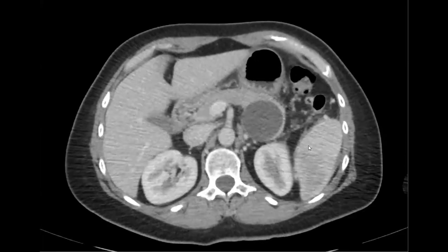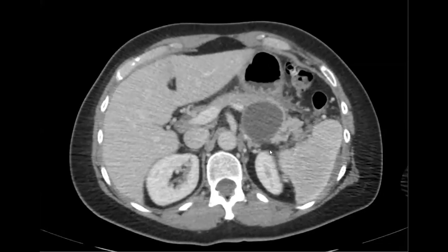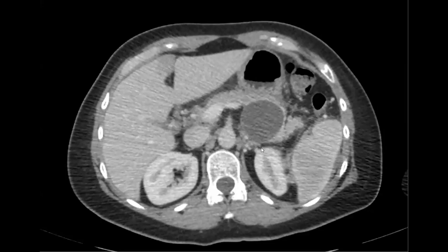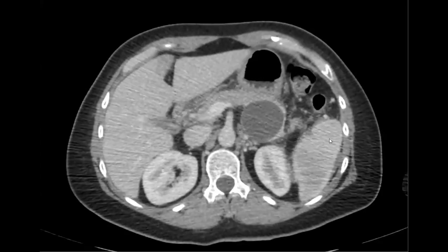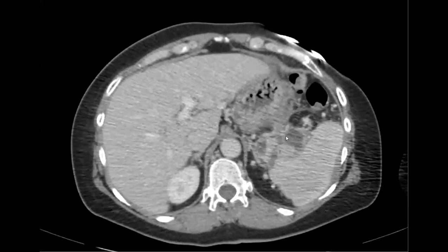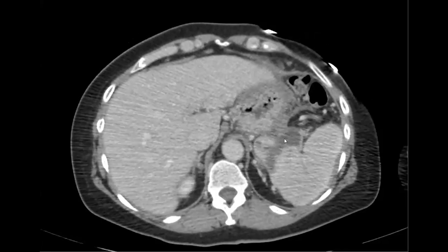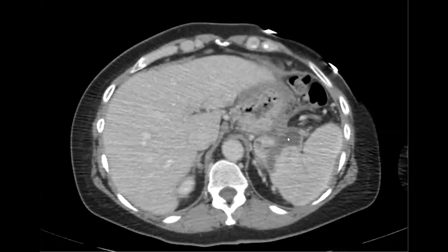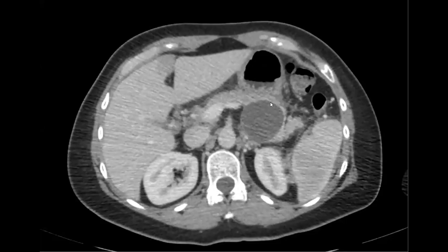Long story short, the whole time they presumed that this patient had pancreatitis, and these were all sequela of pancreatitis and pseudocysts, and their lipase had been elevated at some point. However, they resected this, and it turned out to be an MCN. Wow. In retrospect, if you didn't see the rest of it... Is the MCN related to the findings in the left upper quadrant? I think the MCN basically caused pancreatitis, and that led to this. Maybe it caused ductal obstruction and perforated, and all of this stuff came back as pseudocysts. They did a distal pancreatectomy and splenectomy, and this came back MCN with low-grade dysplasia.